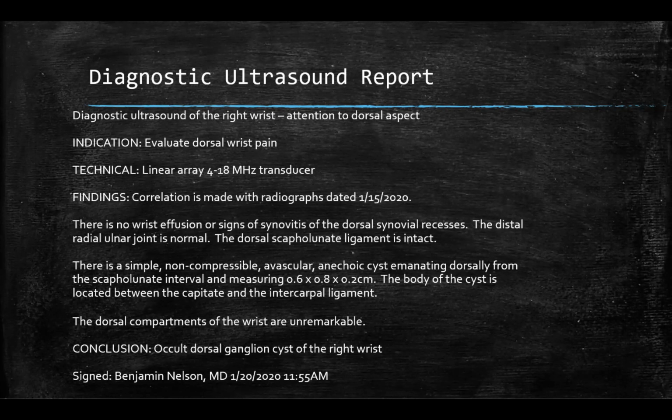But if there are other features that make you not 100% sure, describe it the best you can, put a differential diagnosis in. So if there were different features, you could say most likely this, could be consistent with that. And then you may need to recommend other follow-up as well. And so those are just things to think about with masses.